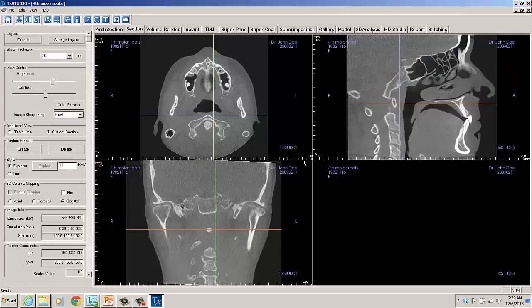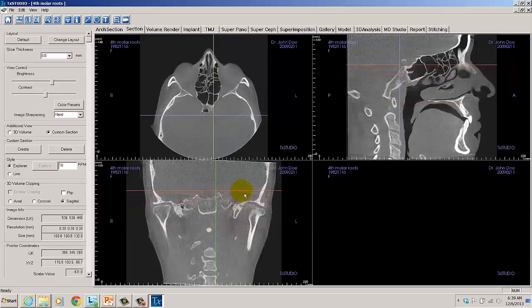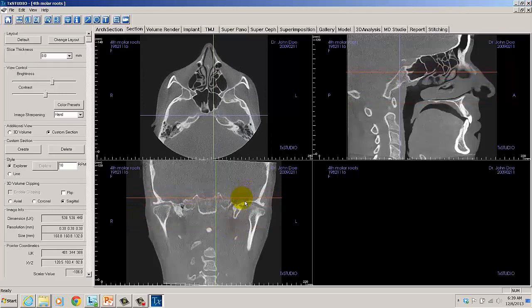What we should consider when reorienting is what anatomical landmarks are to be used to decide when our image is properly centered. Do we look at a level line across the head of the condyle? Do we look at the orbits of the patient? Do we look at the sinuses? What do we look at whenever we're reorienting? We all know that patients are not symmetric all the time, so we do have to take that into consideration.